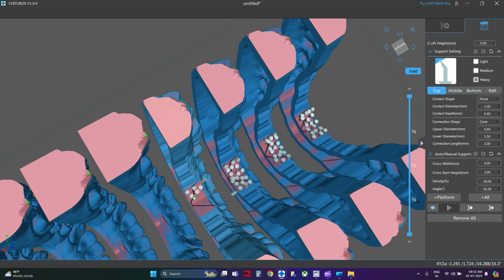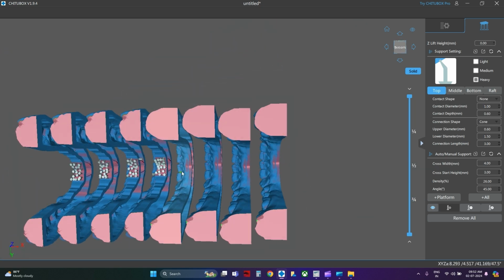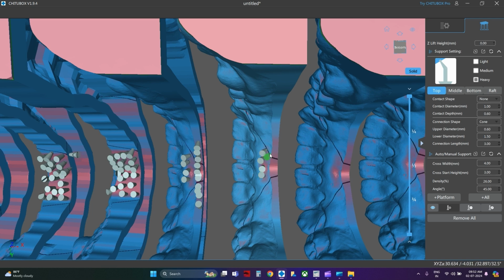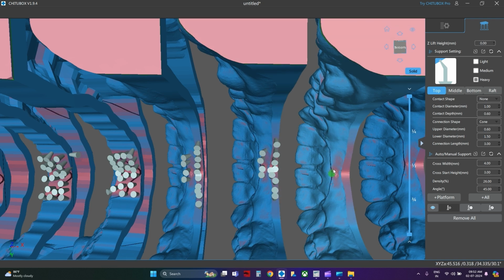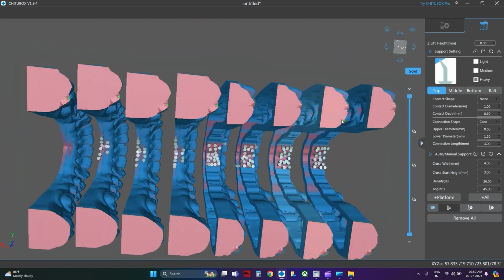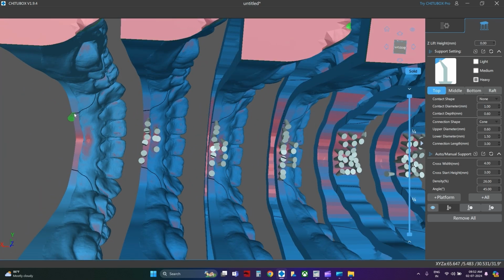All right, so it's beyond my ability to cover more on 3D printing right now, but I still wanted to make sure that you have an entire workflow of the steps, right from importing a case till the slicing for 3D printing. So I hope this really helps and creates a guide for someone who's intending to start their in-house aligner setup.